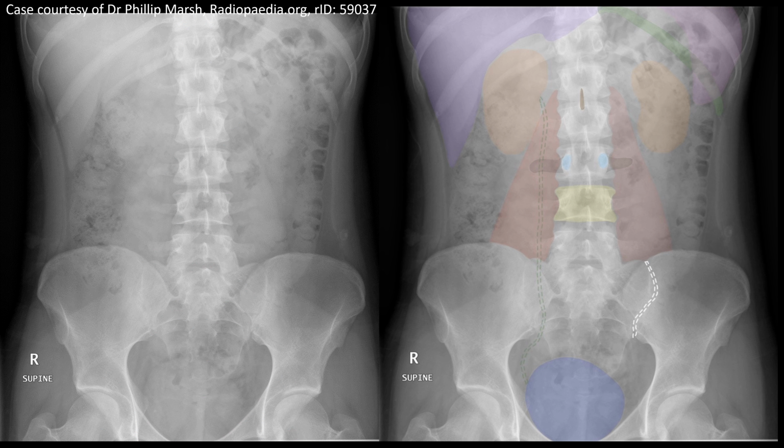Plain abdominal X-ray like this. This is the plain anteroposterior view of an abdominal region showing the anterior superior iliac spine, anterior inferior iliac spine, iliac crest, posterior superior iliac spine, posterior inferior iliac spine, sacroiliac joint, head of the femur, sacrum, coccyx, as well as the vertebrae, 11th and 12th ribs, and soft tissues like liver, spleen, kidney, psoas major muscle, large intestine, small intestine, without any visible abnormality.